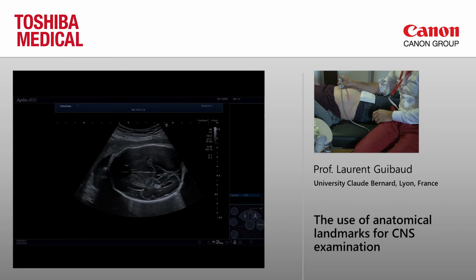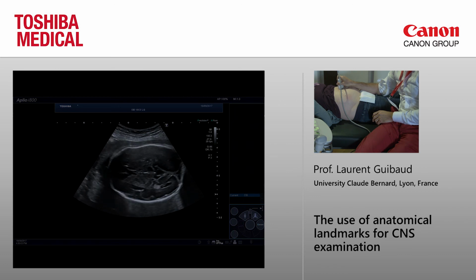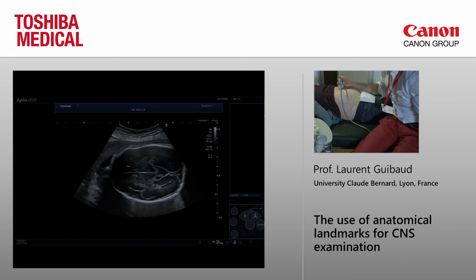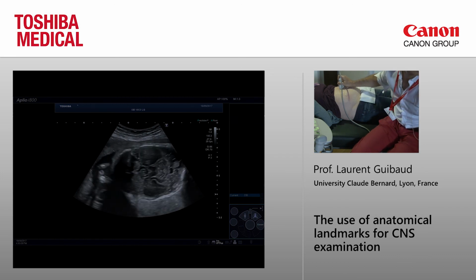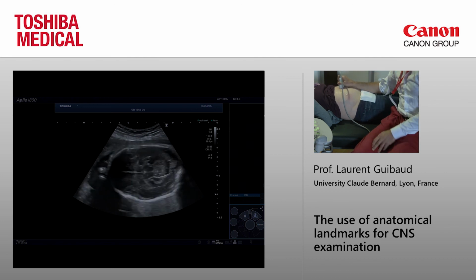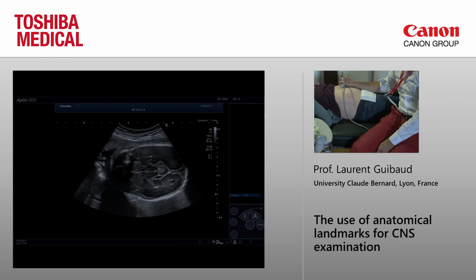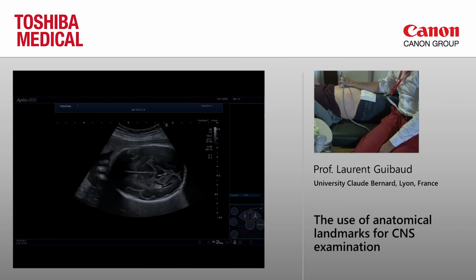Okay. Can you show the measurement for external hydrocephalus? External hydrocephalus. This is a very good question.